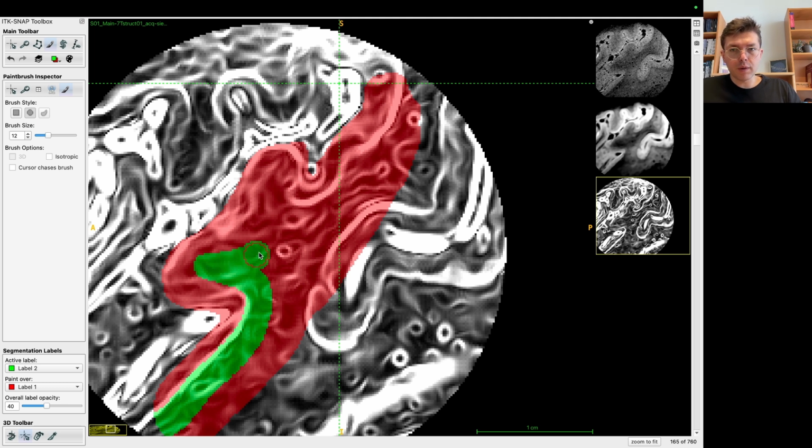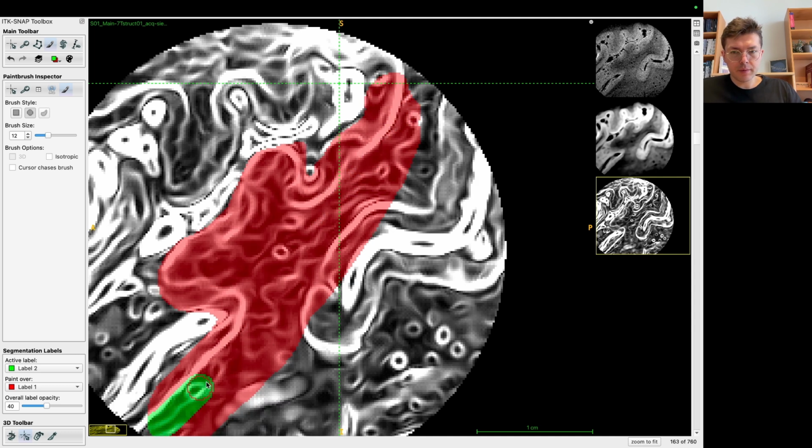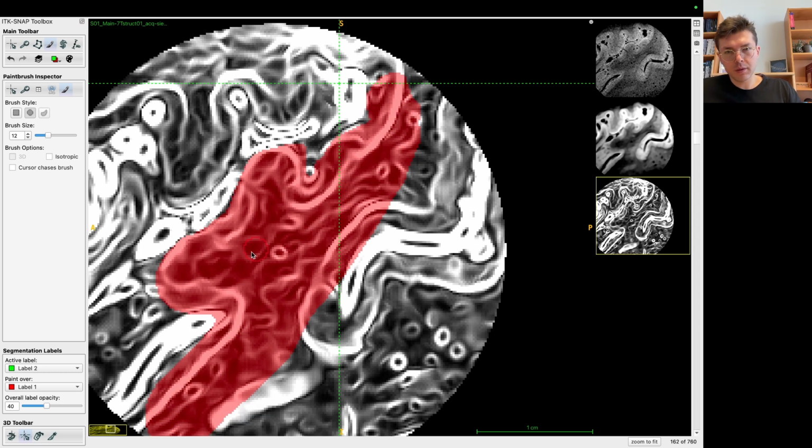By the way, you can also download my 2022 paper segmentations. They are all openly accessible if you want to see more examples. I did put my segmentations out there together with the processed images. Smaller brush there. I normally listen to audiobooks, but now I need to record myself in silence doing this work.